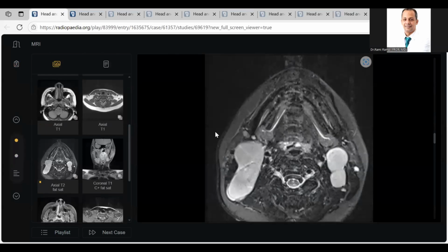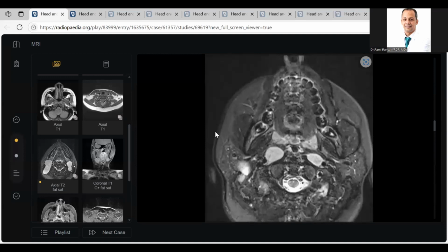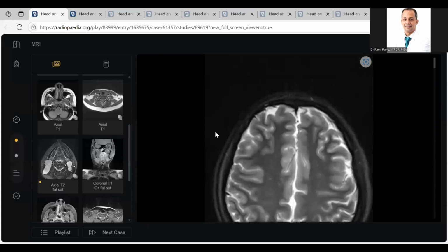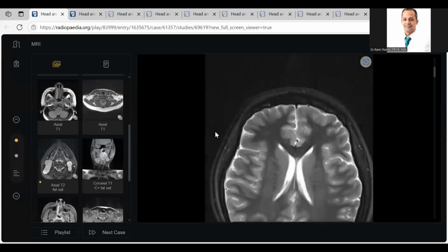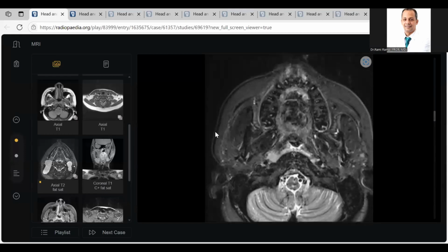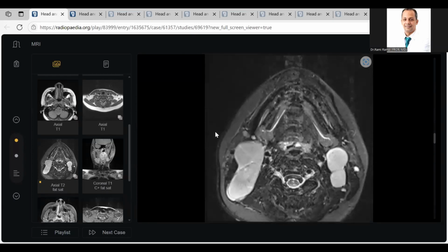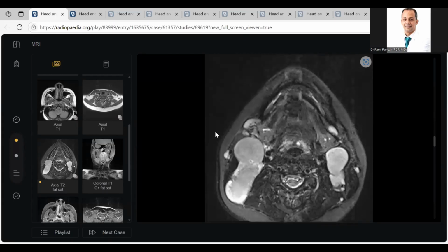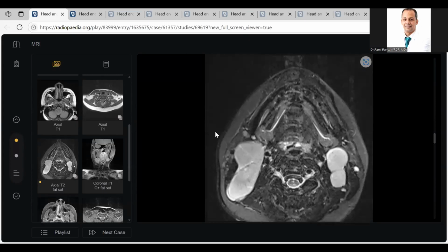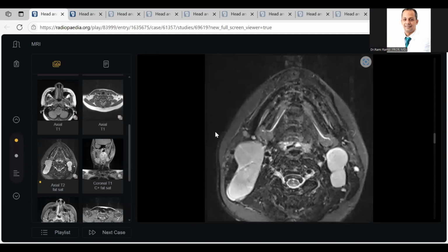Thank you, sir. Doctor, you made an amazing start, and then you didn't wait to search the rest of the examination like I advised you, from the first to the last slice. It is impossible for this very large, huge, amalgamated, bilateral, globular-shaped lymph node to be put in your first diagnosis as benign. I'm not against your diagnosis, but it should not be at the top.